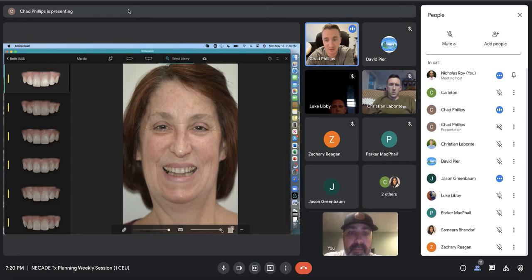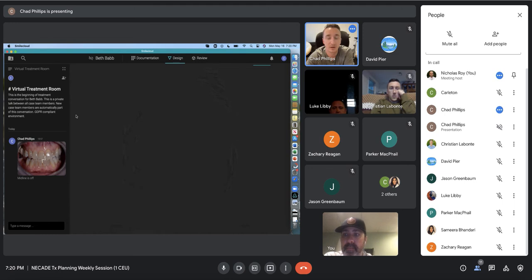Yeah. So then this controls the shade down here. For her, I was going somewhere in the middle, but towards the dark end. And then I believe this just goes back and forth between the two. So it's literally that easy. Wow. And the good thing about these is that you can also download the library of mock-up shapes.